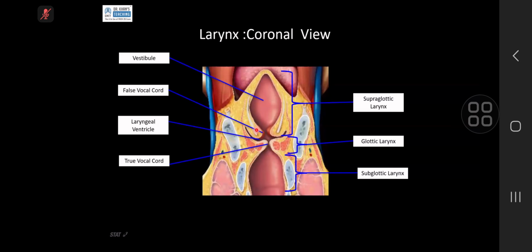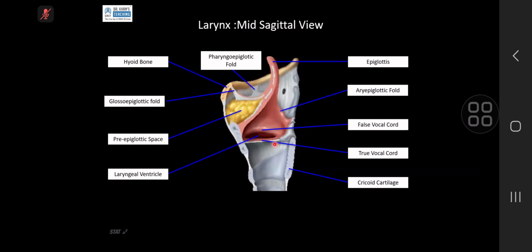And many a time you will not see the connection between that dilated laryngocele and the ventricle. So this ventricle should be in your vocabulary. Now, this diagram once again tells you how you divide into glottic, supraglottic, and infraglottic levels.